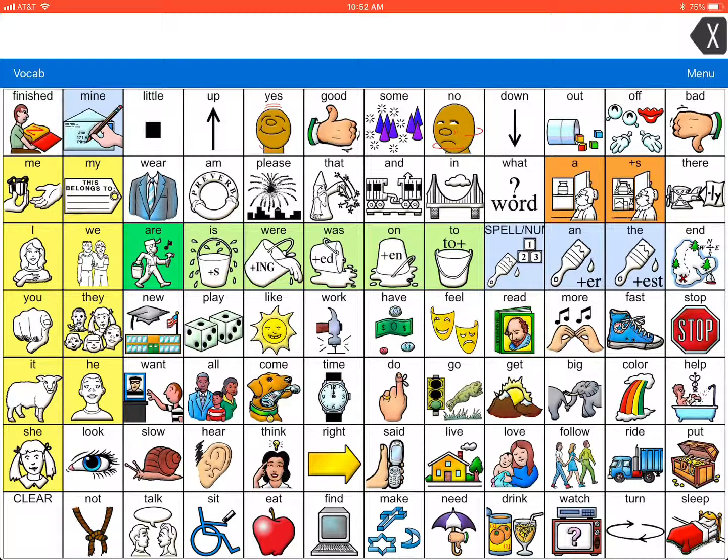There's no jumping from one screen to another or sequencing more than one hit in order to hear the voice output. This can be reinforcing for students and for listeners because it is very simple and basic, and you hit one symbol one time and you hear the voice output. But it does not teach the motor planning that's involved in the more complex vocabulary, which would be the full version of the LAMP system. It's recommended that students don't stay on the one hit for very long because it doesn't teach them the motor planning that's involved in the full version.